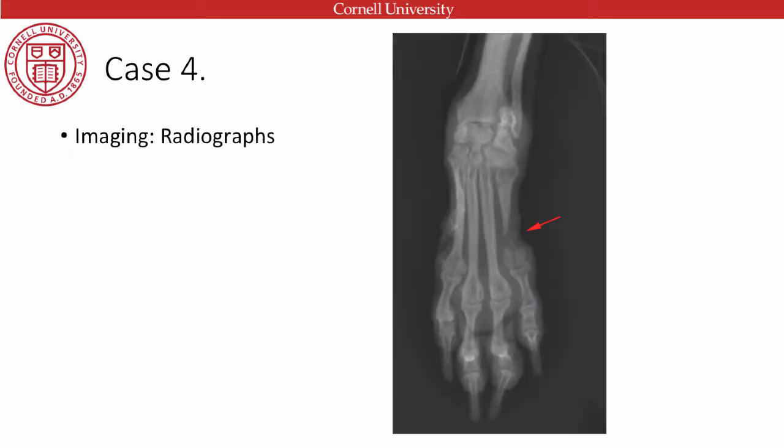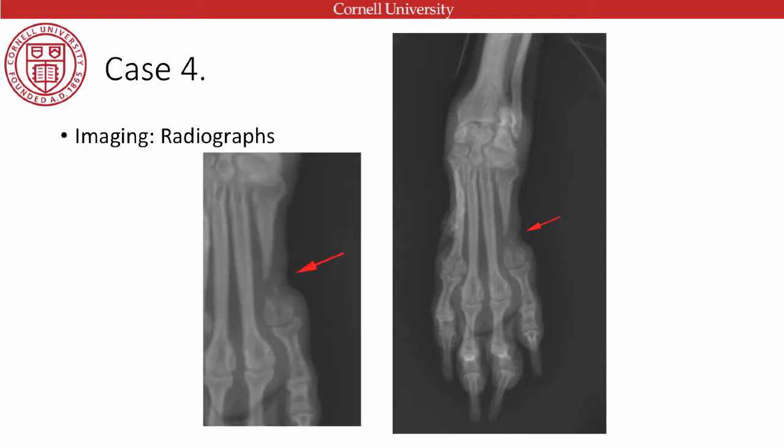So this is the radiograph. What are your thoughts? Yeah. So this is a deviation in the soft tissues, exactly where this matted coat was lying. And then the bone underneath, as a result of this constriction, interestingly, has resorbed. And she's got now a pathological fracture of this bone as a result of that, and a completely demineralized bone. And the concern for that is, is she going to respond? If we dematted her and stabilized that, would that come back? And that's a question that is unclear.